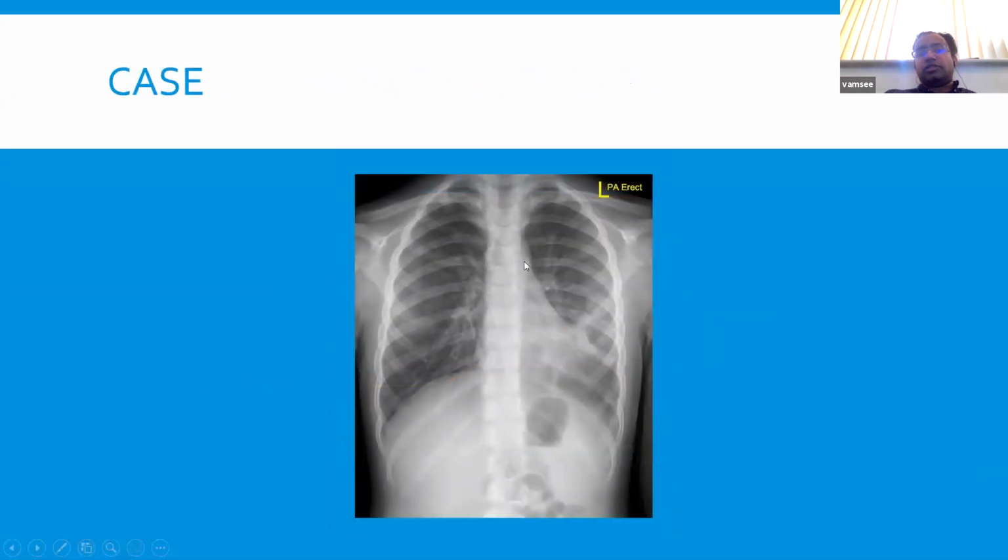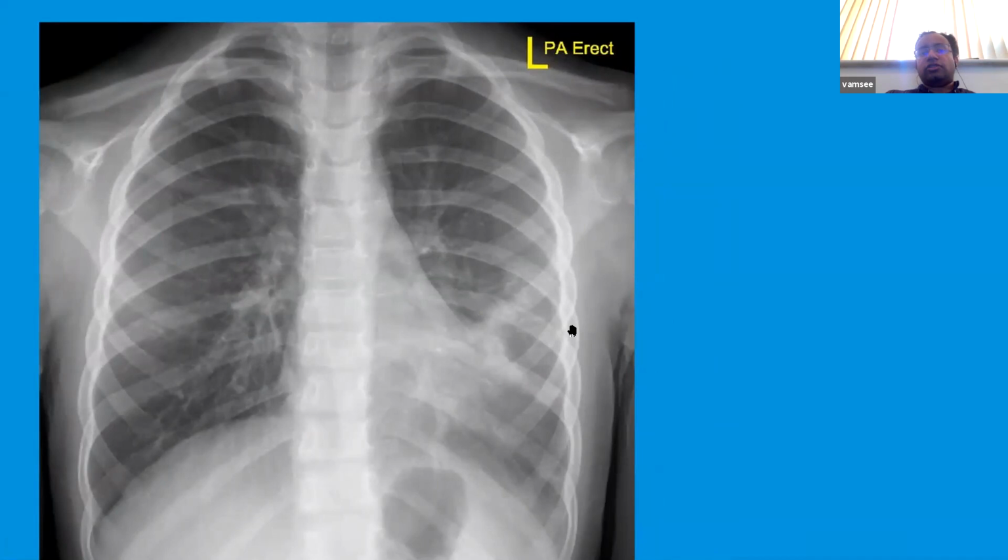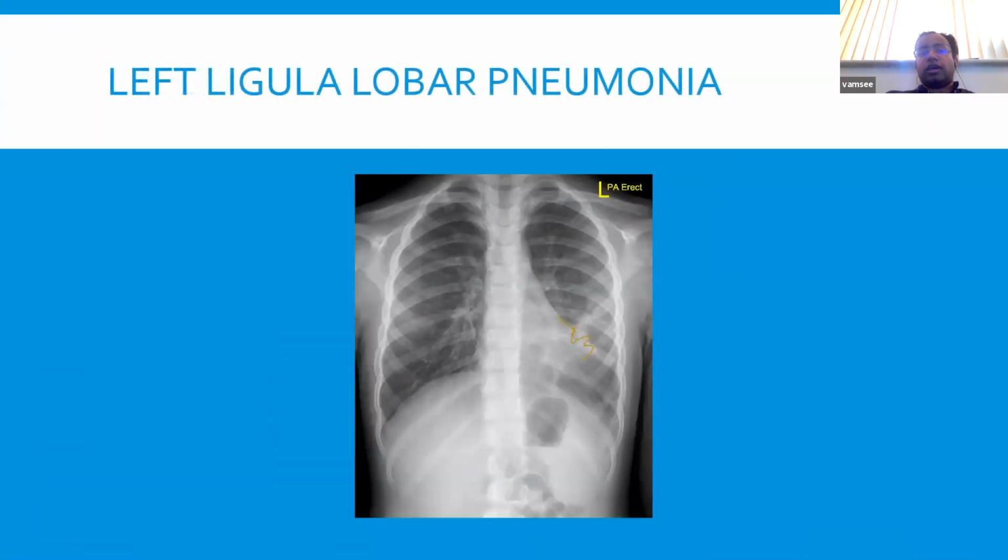In this particular case, you've got your normal crisp pattern going along there. If I draw your attention to the highlighted portion, that normal clean pattern has become much more fuzzy, which would suggest something is going on there, which, based on the location, would probably be in the lingular aspect of the left lobe.